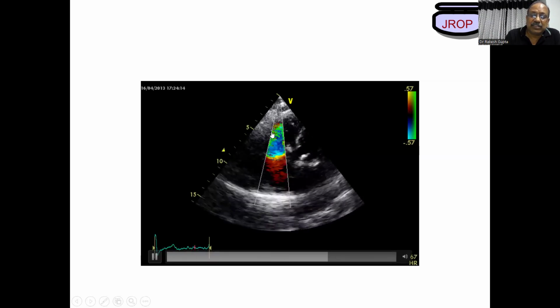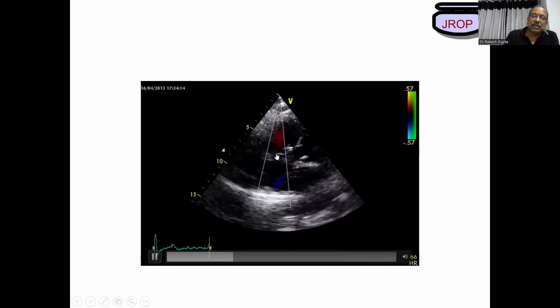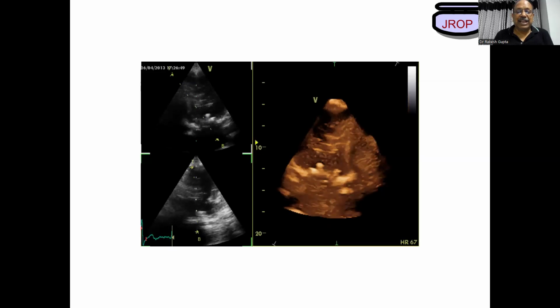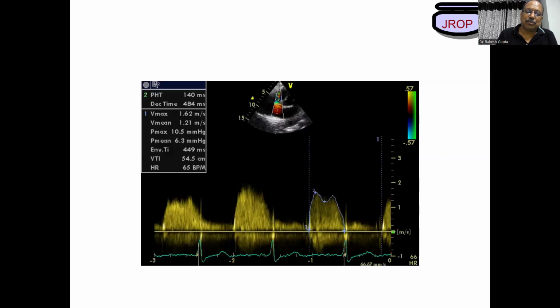So we have to use what we call a low profile area, and we try to put in a bioprosthetic valve in this subset of population. The bioprosthetic valve definition and evaluation remains virtually the same as we talked about previously during the mitral valve. Look at the peak velocity and mean gradient, but put an emphasis on what?